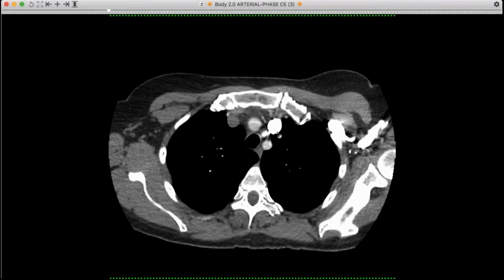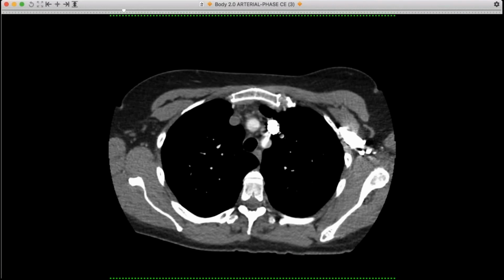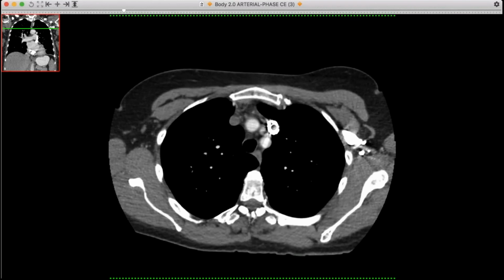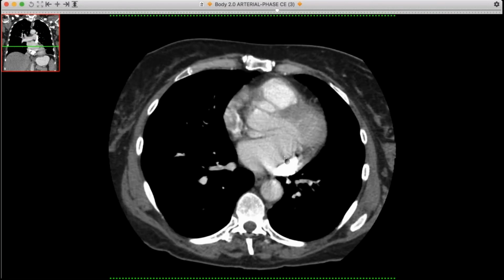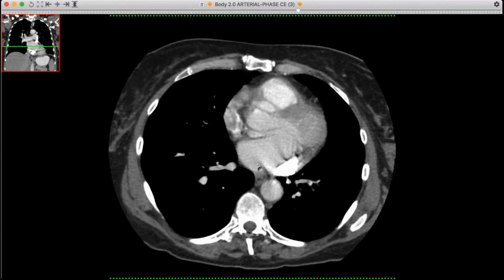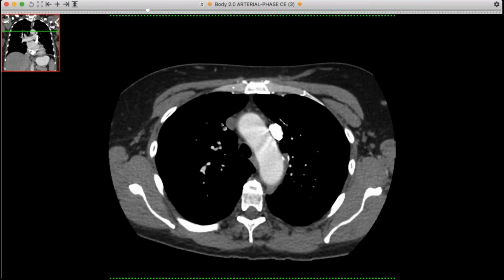And so along the discussion of the last case, in this particular case, we don't really see a brachiocephalic vein. There's some thymic veins. Rather, we have duplicated superior vena cavae. You can see this is a left injection, and we can follow the contrast down. There's a large intercostal vein coming in, and it continues as the great cardiac vein joins up and drains into the coronary sinus and into the right atrium. So a typical left SVC. But what's unusual about this case is that when there's a duplicated SVC, the bridging midline vein is usually absent, and that is indeed the case.